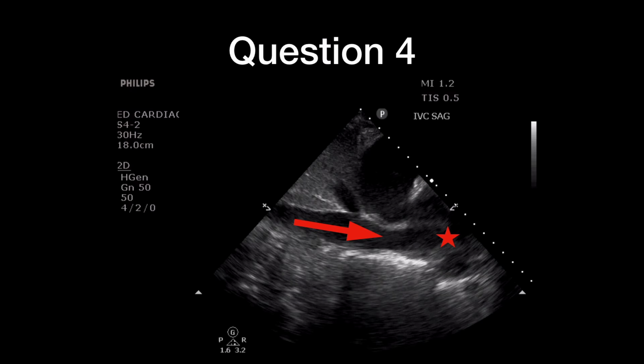So in question 4, you were asked to think about a patient with aortic dissection, and if he developed a large pericardial effusion, which can happen quite commonly if the aortic dissection goes back into the pericardium. And what we wanted you to do here was to take one of your remaining long axis images. So remember, in the images you uploaded, you should have a long axis image of the heart, which we used already to look at the aortic valve, and a long axis image of the IVC. And so you were to take your remaining long axis image, put a star in the area of the heart that would collapse first in a pericardial effusion, and then also an arrow to indicate the direction of blood flow that goes into this chamber.